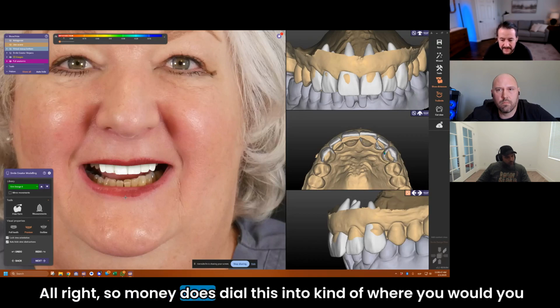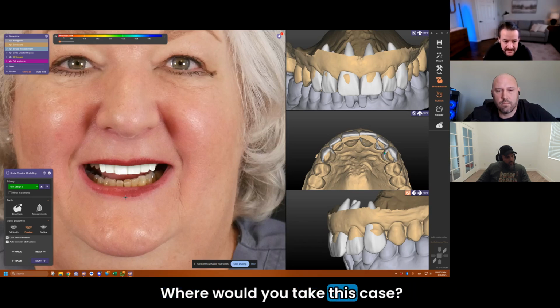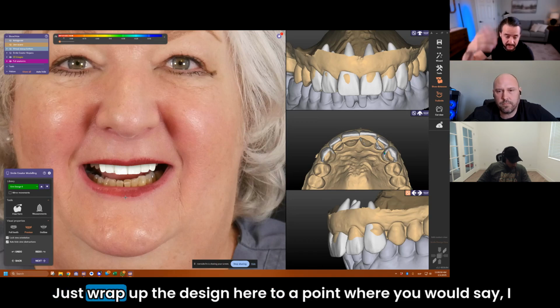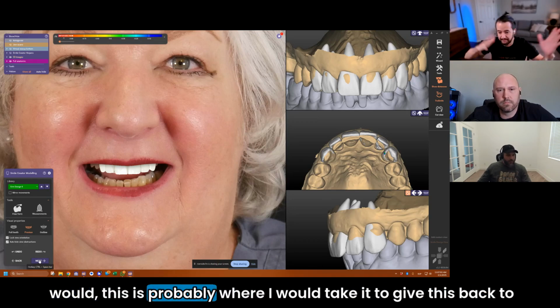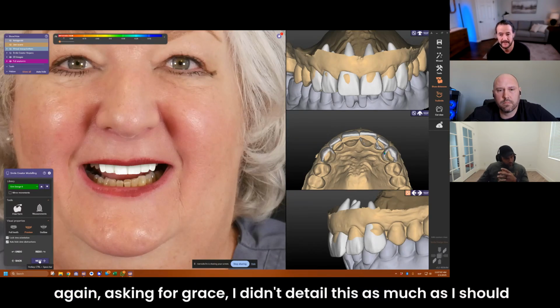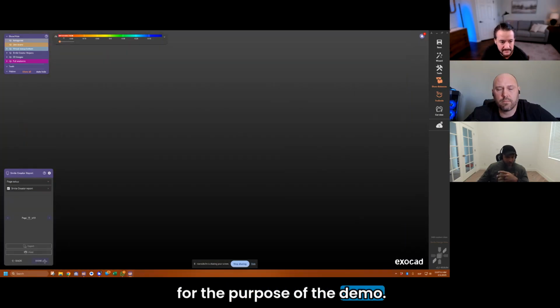All right, so why don't you just dial this into where you would like it if you were going to deliver this back to the doctor? Where would you take this case? Sorry, say that again. Yep, just wrap up the design here to a point where you would say, this is probably where I would take it to give this back to the doctor to show the patient. So again, asking for grace. I didn't detail this as much as I should for the purpose of the demo.